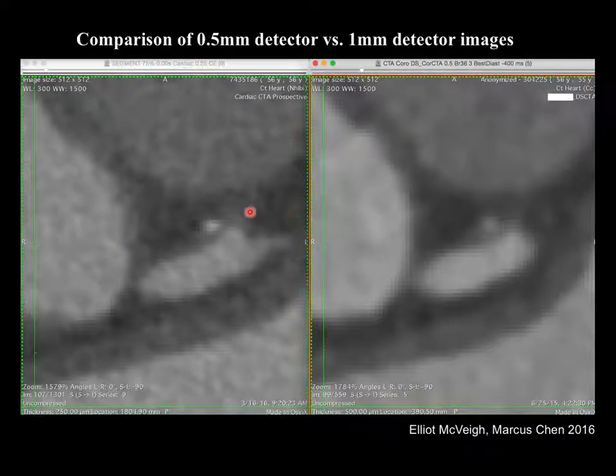And here's a comparison on the high-resolution scanner on the left and the Siemens scanner on the right. You can see the signal to noise here is higher, right? If we were just to measure the signal value, divide it by the root mean square deviation of the background, it's much, much higher over here. However, this image probably has greater information in it because it just has a higher spatial resolution, right?